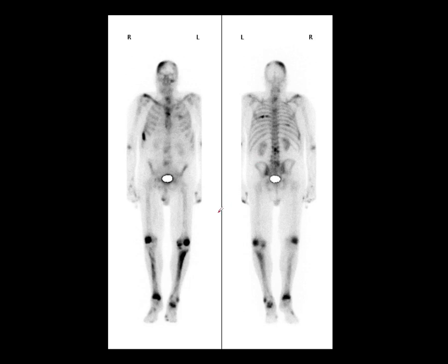Now, I did mention hyperparathyroidism, so I just thought I'd throw this picture in here. Hyperparathyroidism can also cause multiple focal areas of increased activity, not in a dissimilar pattern to metastases, but the uptake is a little more random, so it's rather unusual to have, although not impossible, metastases in these odd positions. This is a patient who had multiple brown tumours from hyperparathyroidism. So if you're doing a bone scan for a patient with unexplained hypercalcemia, just remember to consider that before you suddenly jump in and give the patient a diagnosis of multiple metastases.